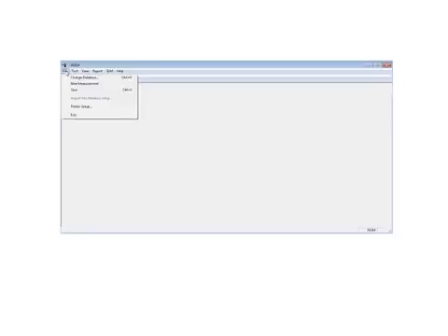The quickest way to get the software going is to bring up a previous test. It's convenient using a database to have a test that was done maybe a year ago and to bring up the same test to start a comparison test on the same audiometer. There is data entered into the audit database. This is part of the startup and maybe the most tedious part of using the software. You'll go in, create a new database and a new measurement and save those items.